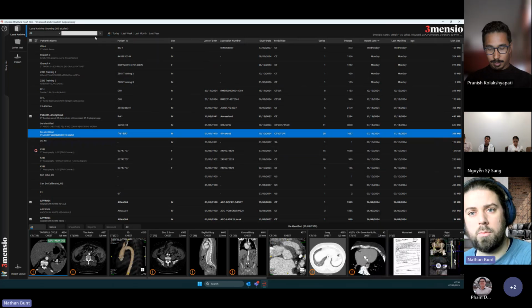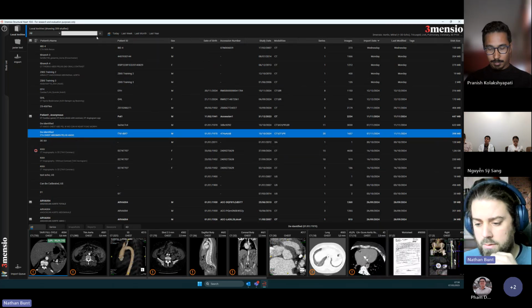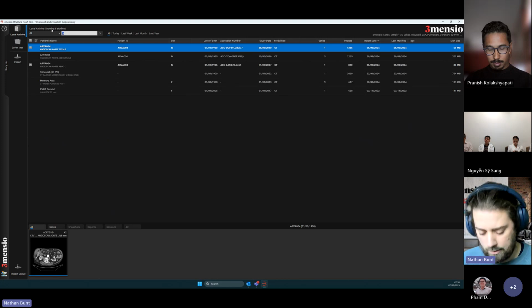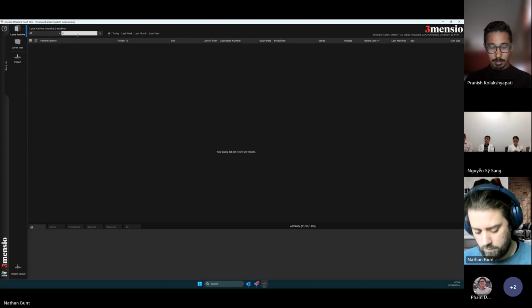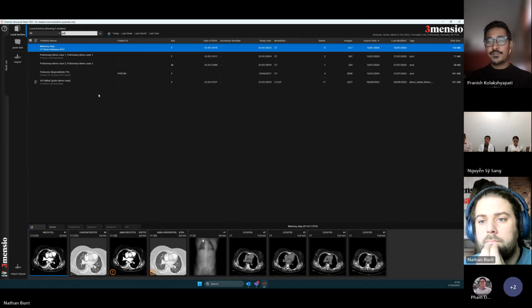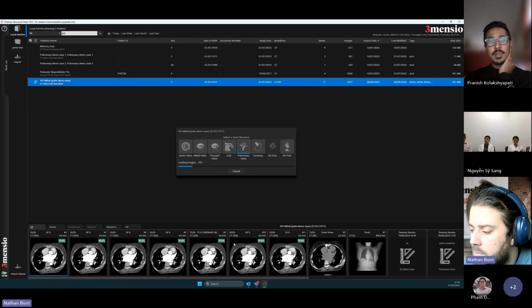So today we'll be looking at the pulmonary, after, of course, you already looked at the LAA module. So I'll just start with opening a case and then selecting the pulmonary valve module.